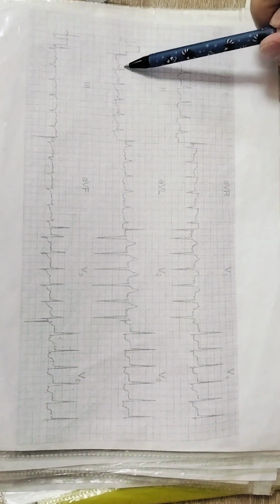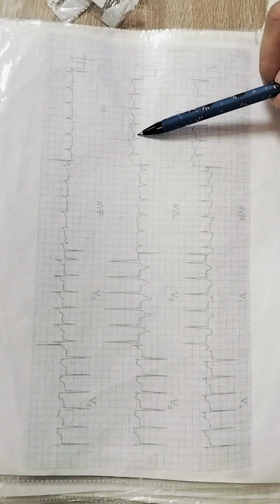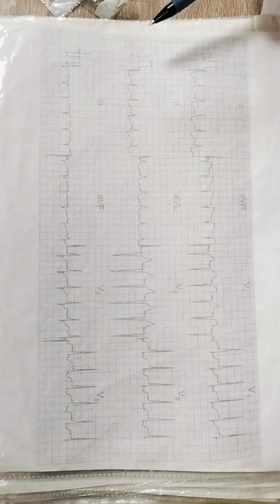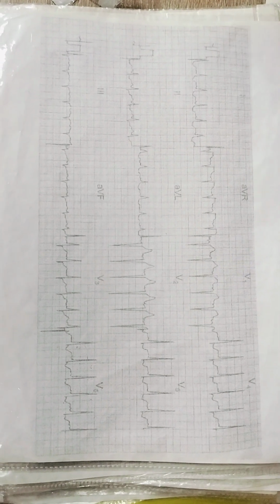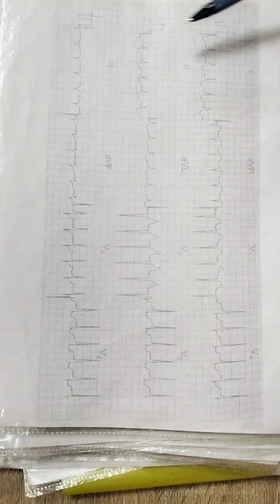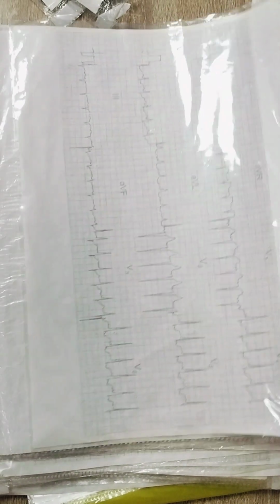In this case, P plus short distance. So there is sinus rhythm, there is tachycardia. Rhythm is regular. Other pathologies we will discuss in future. This wave is bigger than this one and this one. So it is a shift of the electrical axis of the heart to the left, levogram.